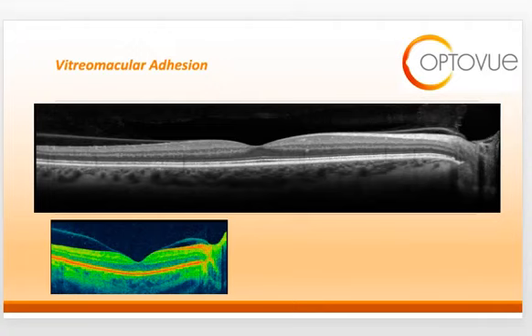And what I'd like to show you on the next couple of slides are what these should look like in normal individuals that are not having any pathologic type of entities going on. So this first slide here shows you the first stage in what we call a PVD, or posterior vitreous detachment. And we call this a perifoveal vitreomacular adhesion.